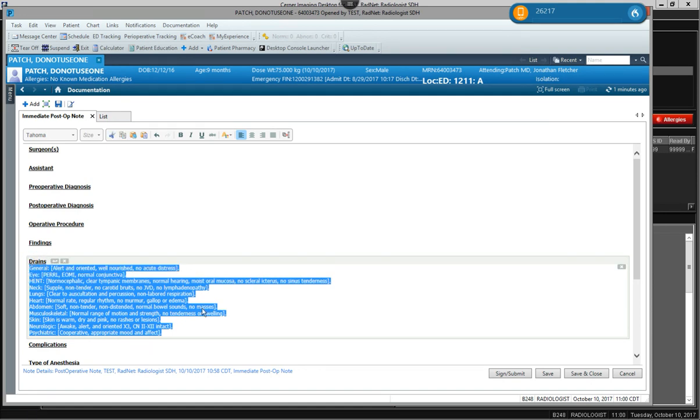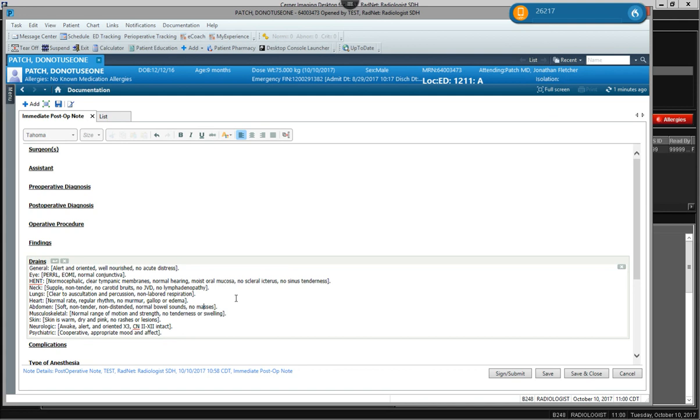In fact, I'll give you just briefly here a demonstration of that. I'm using a Cerner. I'm actually using my iPhone as a speech mic, and I'm using the next field. And as I click, it starts highlighting. It'll highlight the next field in front of my cursor. So if I move my cursor up here and hit next field, then it highlights. And this process works very fast on a hardwired mic.